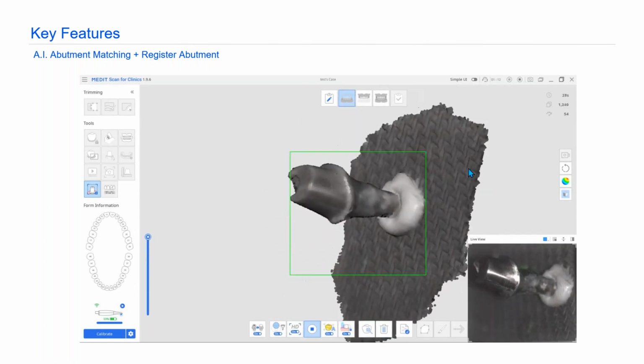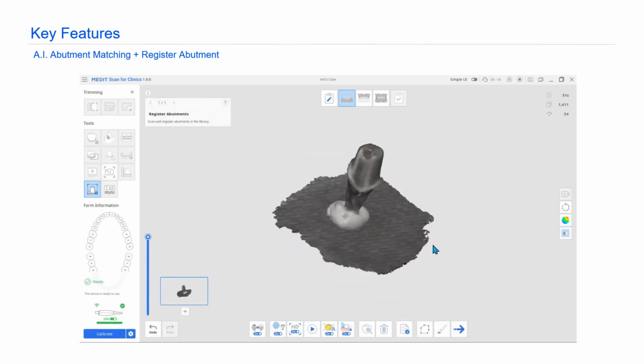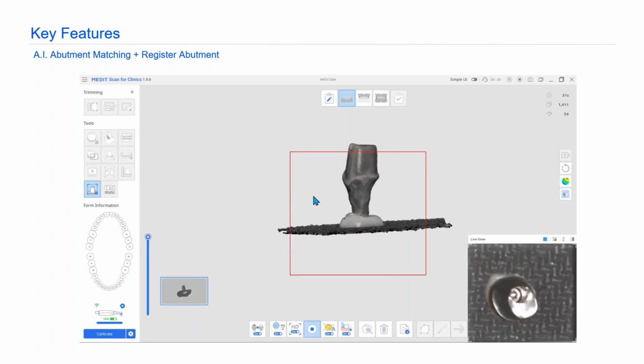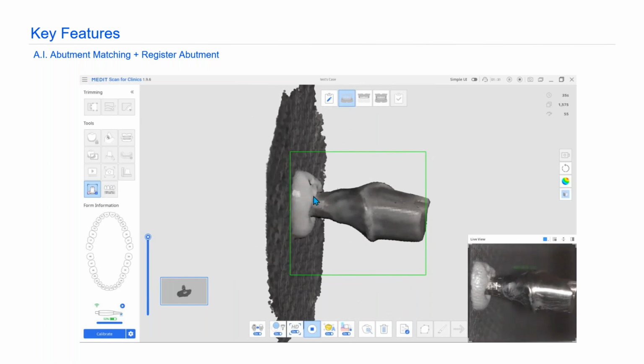And then we'll inspect this custom abutment. And remember, the one that you just saw earlier was a stock abutment. That's something that you would pick up from your manufacturer. This is custom designed for this patient's case. So we've got this custom abutment. We're going to scan it and inspect the scan data. And if you need more data, you're going to add more data.